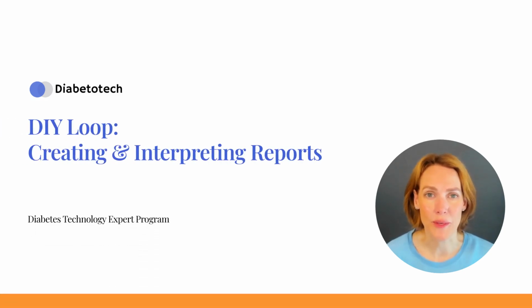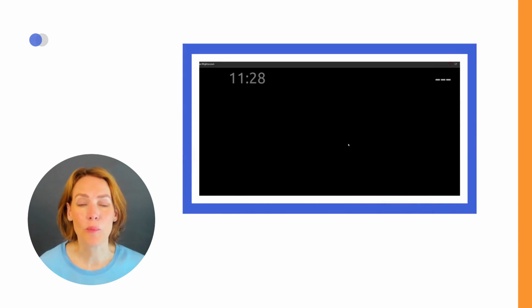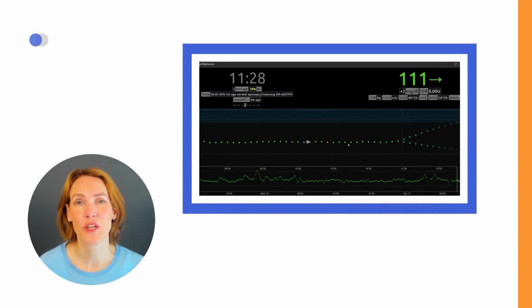Welcome to this video on creating and interpreting reports of DIY Loop via Nightscout. Previous videos have covered the steps to create a Nightscout website and connect your DIY Loop app to Nightscout for data transmission every 5 minutes.